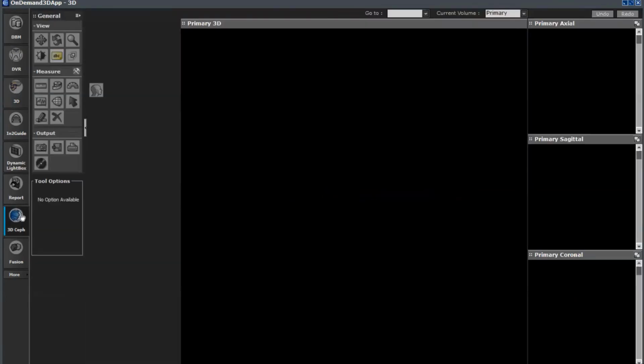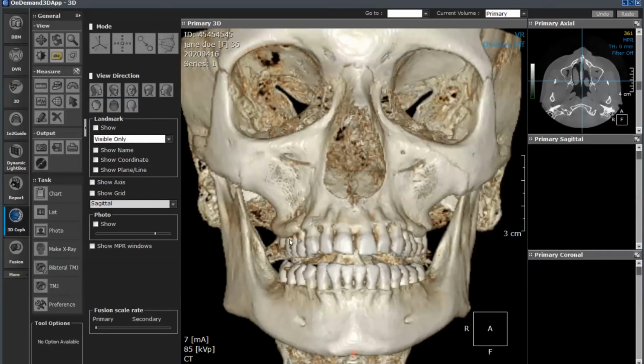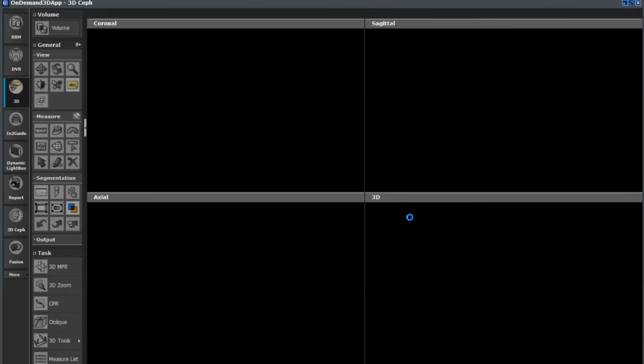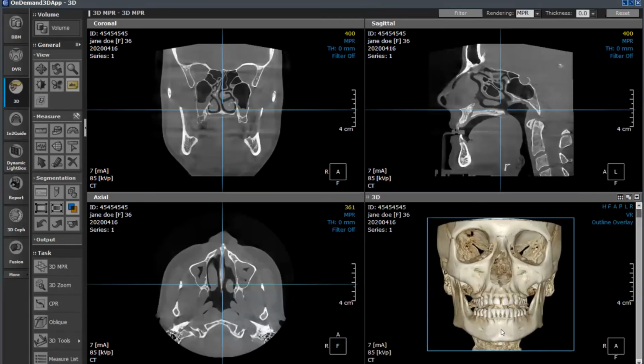We could go in, and as I said in another discussion, we'll talk about the fact that we can do 3D cephalometrics off of this. We can add a patient's photo to the skull itself, so that now this becomes a great thing to discuss with your patients about their procedure and their CBCT, being able to have their personal image and then fade it out to their skull and then work into the 3D mode to actually walk through their images themselves.